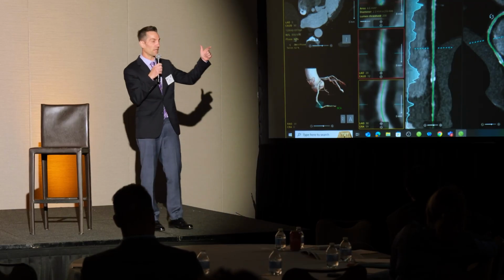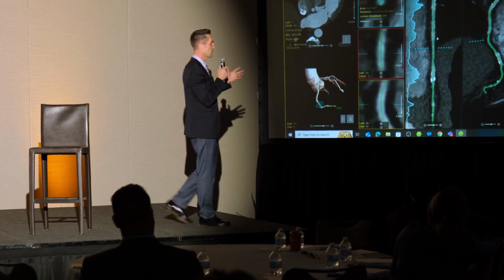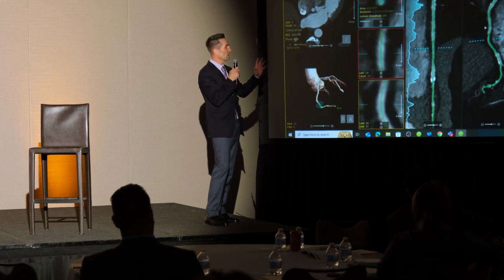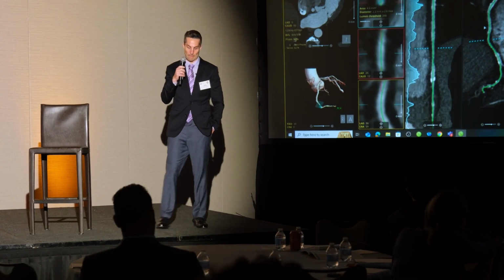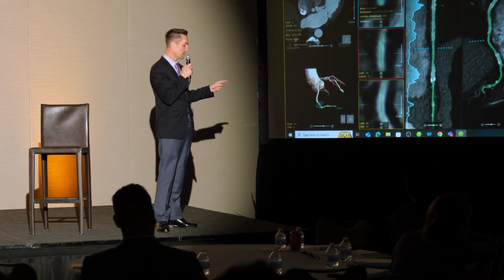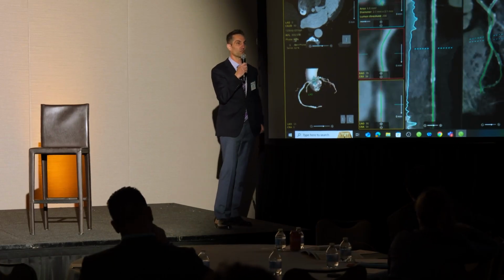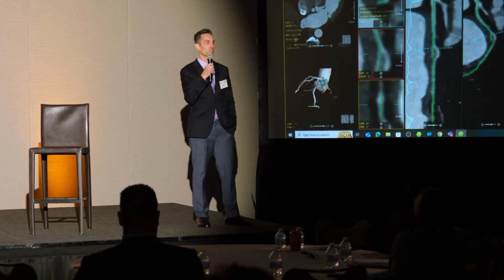So you get a nice layout of the coronary artery in its complete volume, which you can't do unless you do the post-processing. And in the early days this was a very tricky process to do, or with applications in machine learning. Those curved planars that we got often had to be remanipulated because it's the computer tracking a center line down an area of attenuation difference.